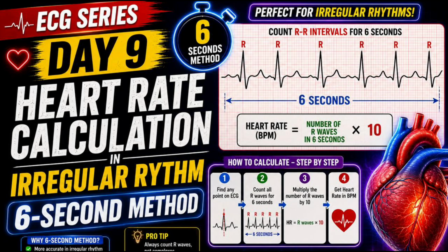So, in day 8, we learned how to calculate heart rate using the 300 method with large boxes, which is useful for regular rhythm. But what if the rhythm is irregular? Can we still use the 300 method? The answer is no. So, today we will learn how to calculate the heart rate in irregular rhythms using the 6-second method and understanding the importance of the RR interval.